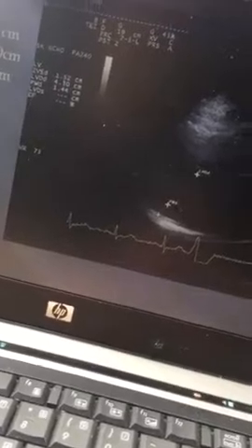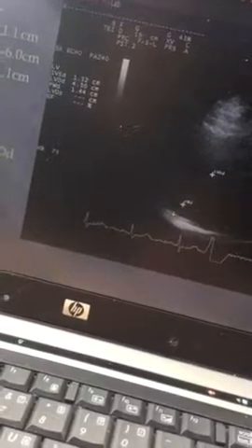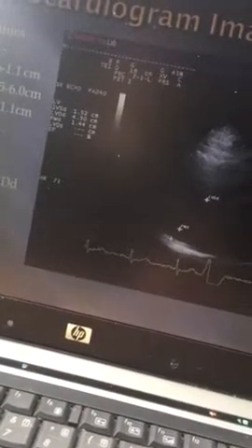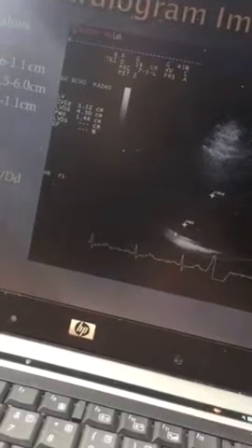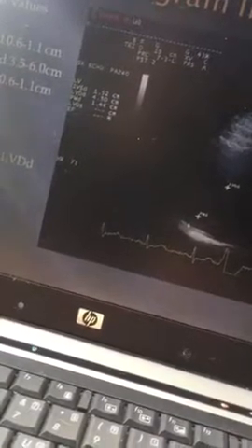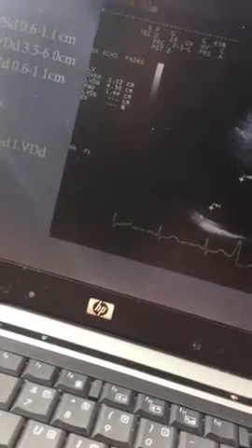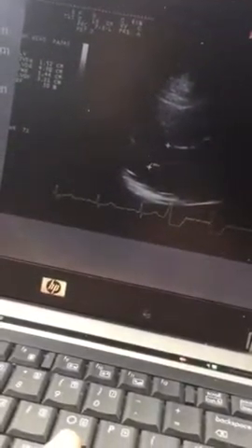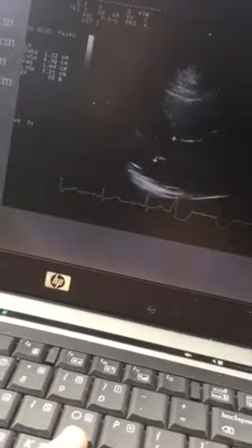When we get to the left ventricle measurements, IVSD was 1.5, posterior wall was 1.4. Both of these indicate symmetrical left ventricular hypertrophy. And we can also see the left ventricle diameter during diastole was 4.3, which is normal. But the report listed this as an enlarged left ventricle. Moving on, we got our ejection fraction at about 50% here.